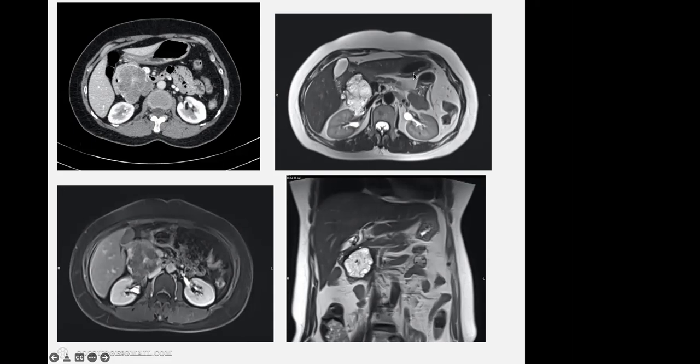But on MRI, if you see, it appears bright like the fluid structures inside the gallbladder or spinal canal. This is the beauty of MRI to characterize the lesion. The CT scan showed a hypodensity, non-enhancing mass lesion, not sure.